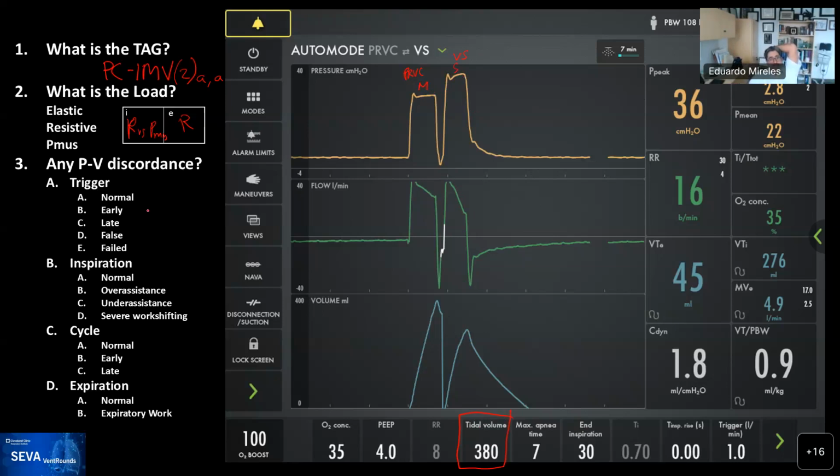So I saw this, and my initial thought was that this was an early trigger. The patient was being weaned from sedation. And so then I noticed, just as I'm seeing that some people have put on the wave, that the trigger was on 1 liter per minute for flow. So you can see it's triggering by flow. And in this ventilator in particular, this can happen, which is a type of false trigger that happens because it's trying to overcome the very high resistance, and so it drops the flow, the pressure as fast as it can.